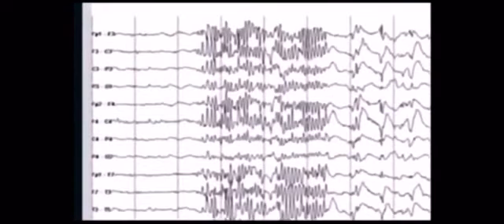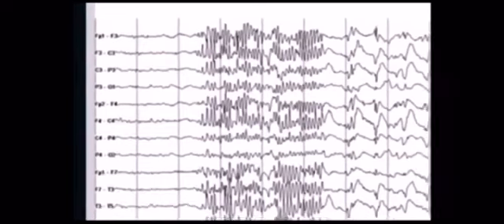What about here? So you see a very fast frequency here. This is out of sleep, followed by some slow spike and wave discharges, maybe 1.5 to 2 hertz spike and wave discharge at a slow frequency, and this is the fast activity. This is called paroxysmal fast activity and something that you see in patients with Lennox-Gastaut syndrome. So in patients with Lennox-Gastaut syndrome during sleep, you may see paroxysmal fast activity. And let's move on to this one.